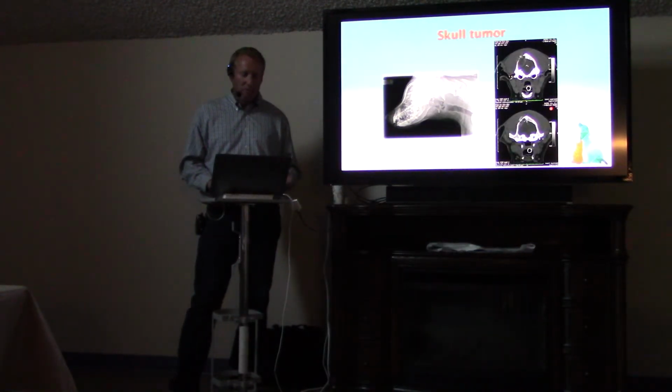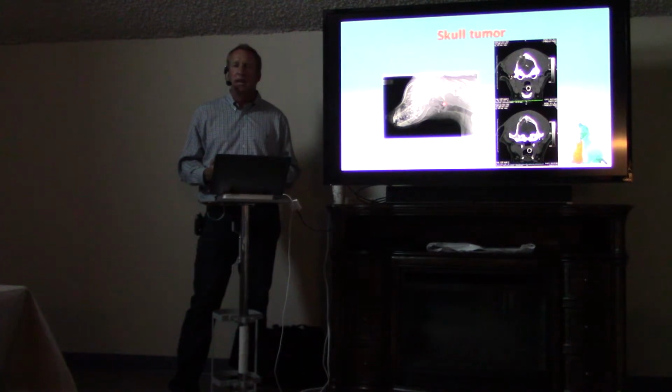And this is an example of that. This dog, honestly, I don't remember why it presented, but skull radiographs were taken, and they were pretty unremarkable. A CT exam was done, and there's pretty severe destruction of the left side of the skull back by the occipital bone. And this ended up being a sarcoma off of a fine needle aspirate.